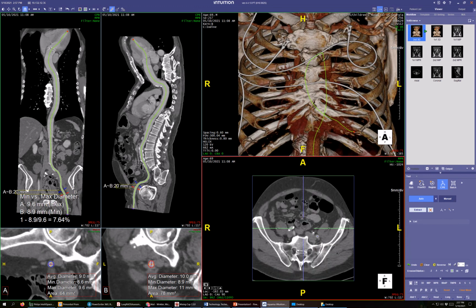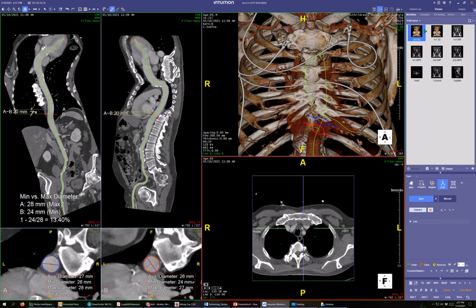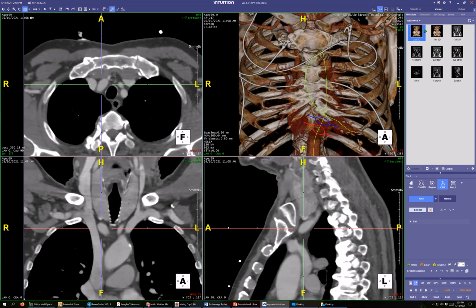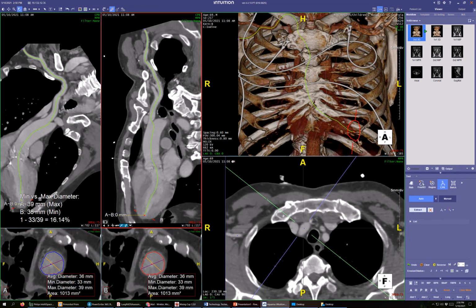Holding down Shift to get that crosshair to appear, and then left clicking. Okay, it didn't work. Well, come back here to 2x2 and get in plane. It's still on auto. There it goes. Nice. We'll come back to 2x2.